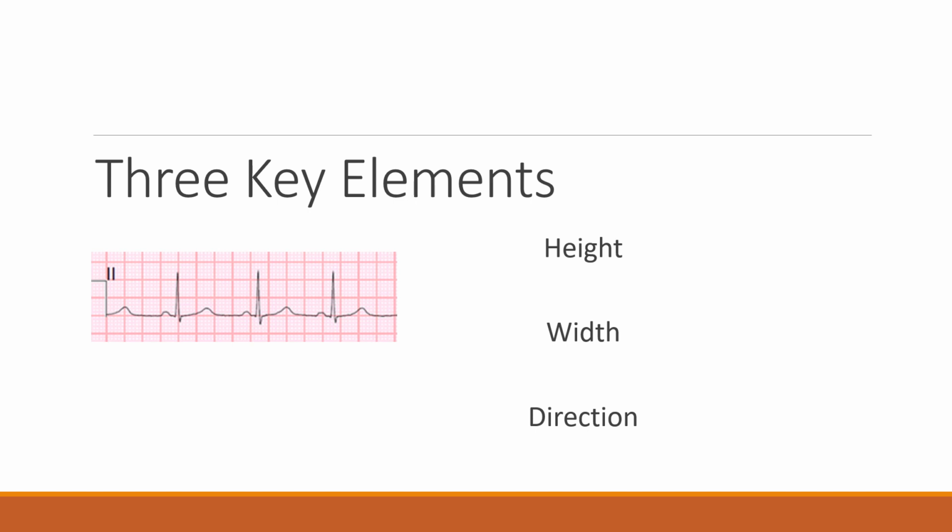That's obviously probably one of the most common ways that we would see that, right? A big heart is just going to produce more energy, and so the ECG is going to get bigger. The P wave might get bigger, the QRS might get bigger, if just part of the heart is bigger. So if I have big P waves, well, that's very likely to be atrial enlargement, since the P wave represents atrial depolarization. If I have big ventricles, well, I'm probably going to end up with bigger QRS complexes. Again, that's not always the case, because there's a lot of variables that affect how much energy the electrode receives. Of course, the heart producing more energy is key.